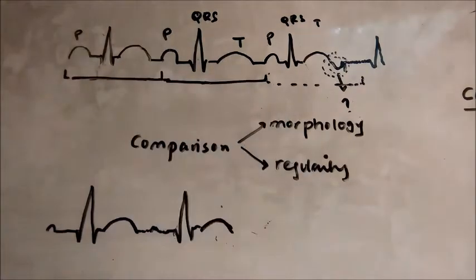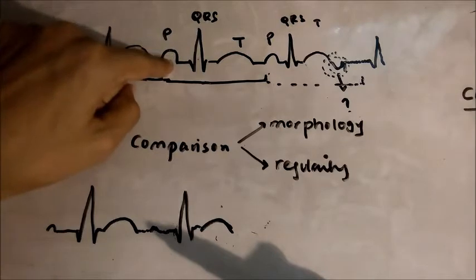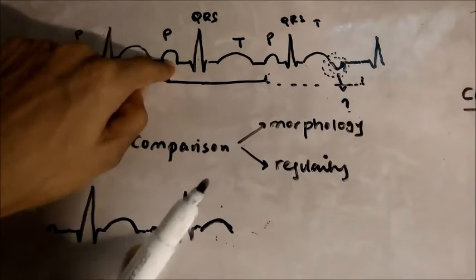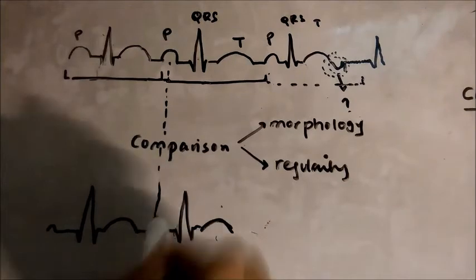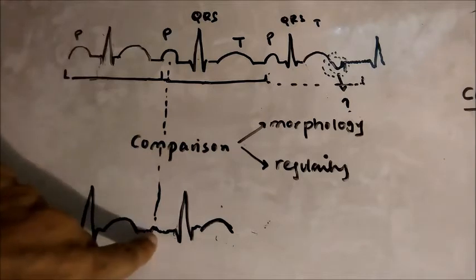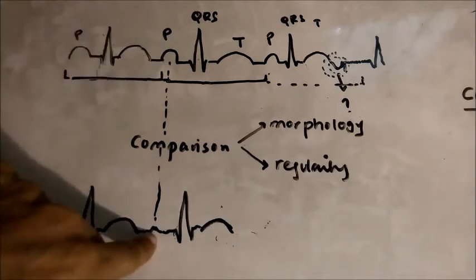What do I mean by a comparison? In this lead, you can see a very good looking P wave. And in order to know whether this is a P wave, all you need to do is go down and see whether it's matching this. If this bump is occurring at the time when the P wave was occurring, then this in fact is the P wave.